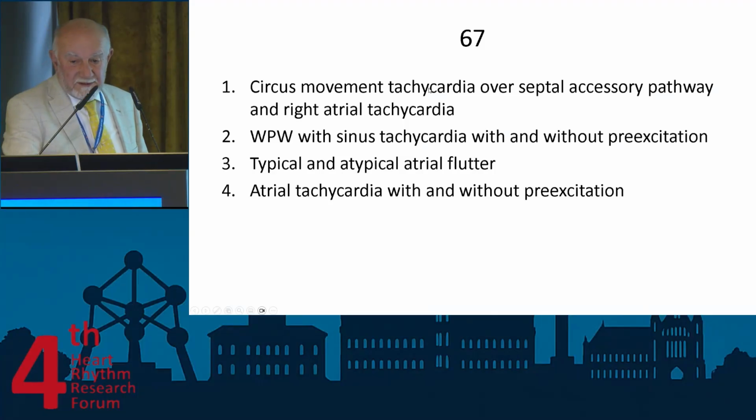And what we are going to do is start with this slide. Can we start with the slides, please? Okay. So we have 2 tracings from the same patient. On the left side, we see a tachycardia, on the right side also. And the thing which calls our attention immediately is that you see these negativities here and here, these positivities. The rate of the tachycardia at the ventricular level is the same. And at the atrial level, well, we see these deflections. The question is, what is that?